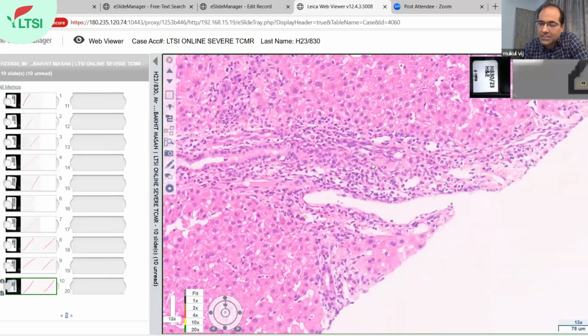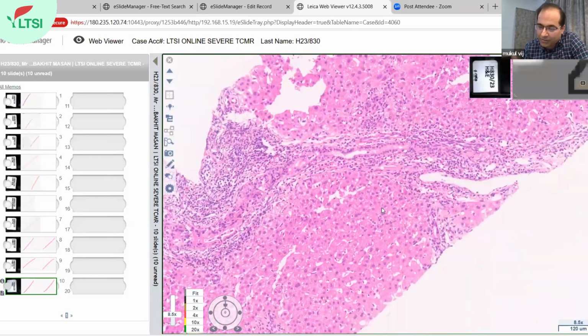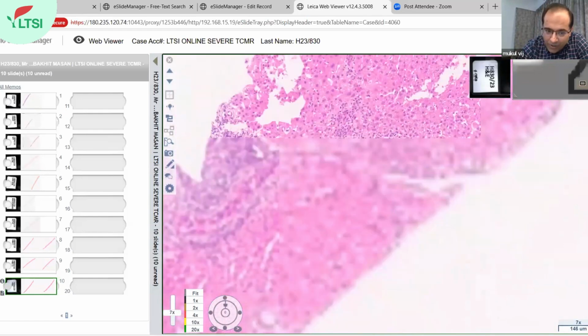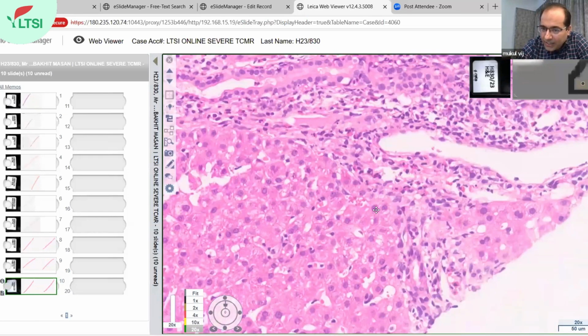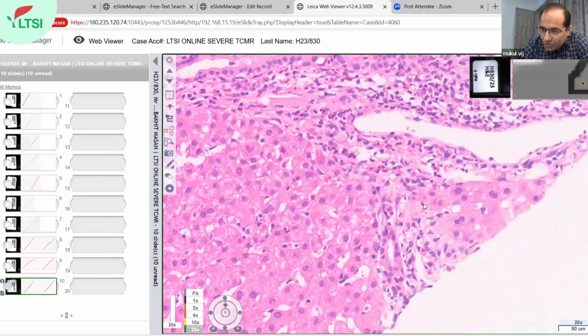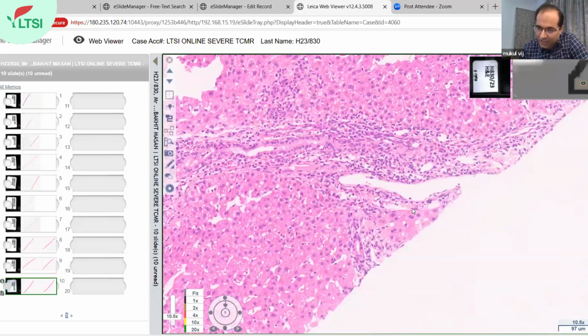This is a post-transplant biopsy, an early biopsy because it's less than 3 months. In this biopsy, you are seeing the typical three signs of the Banff triad: there is inflammation in the portal area, there is ductal injury with infiltration of the duct by lymphocytes, and you can see portal vein endothelitis. So all these features are consistent with the diagnosis of rejection.